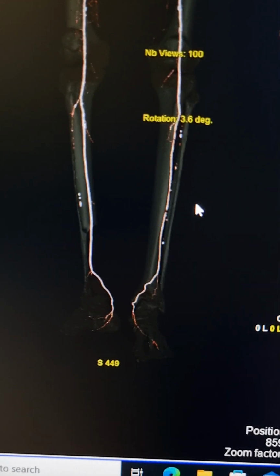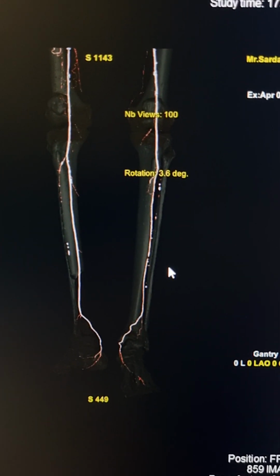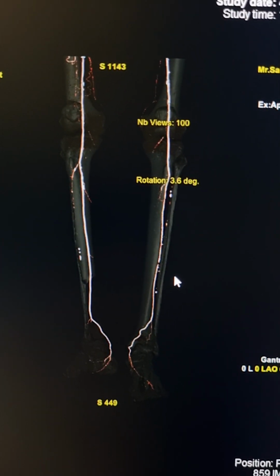I'm sorry, this is a long video, but I just wanted to show you the graft and the extent and how to report such cases.